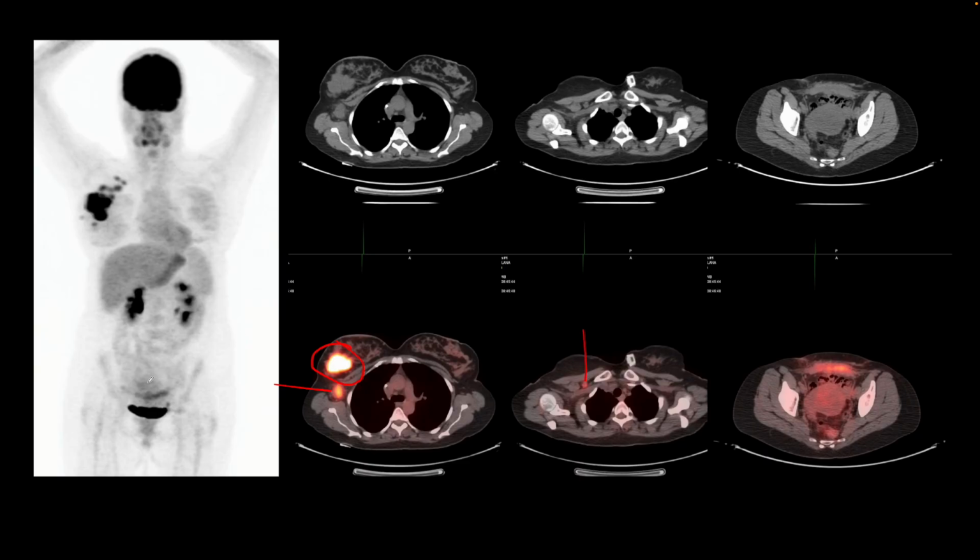And then in the pelvis, we see this linear focus of mild to moderately severe FDG uptake, which is also seen here at the site of scarring from their C-section surgery. So they were diagnosed with breast cancer at the time that they were pregnant, and then they underwent a C-section followed by staging for their breast cancer, and then they got the treatment.